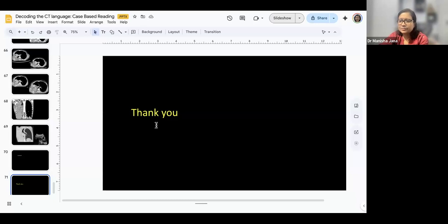And HRCT, you don't need to write separately. Usually HRCT reconstruction is done in all CECT as well as NCCT. That part is the same. Still, if you have any doubt whether they will get HRCT sections or not, you can write CECT with HRCT reconstruction. That will be enough.